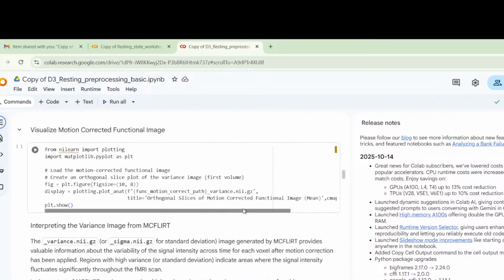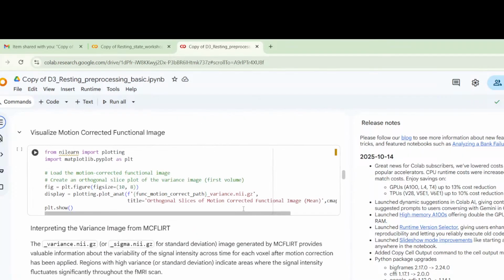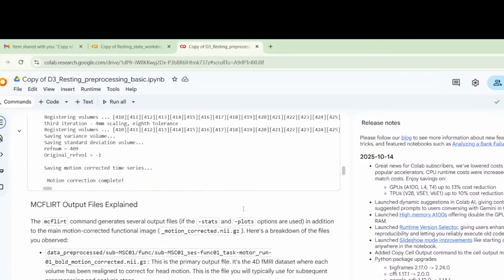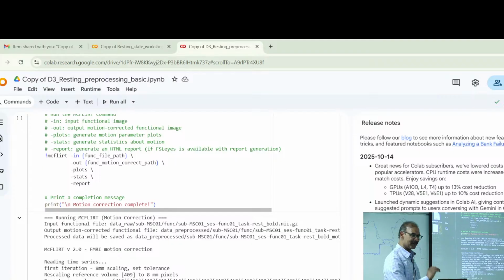Those of you who came a little late, go through chapter, like day 3, which is resting state, because by the end of this class, I want everyone to have generated the resting state images. So now many of these packages, after you use different options, will write out even a paragraph for you to be used for your paper, right, with references.